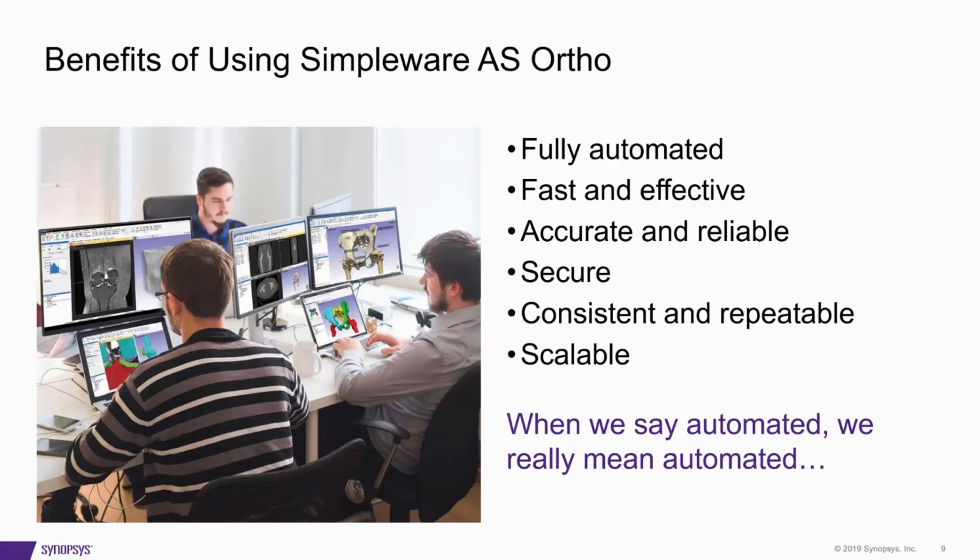It's really reliable and accurate. So the Simpleware machine learning algorithms are trained by experts and verified by clinical professionals. It's also secure. So we're protecting your patient data by keeping it on your local hardware. You don't need to transfer confidential data onto outside servers in order to be processed and sent back.